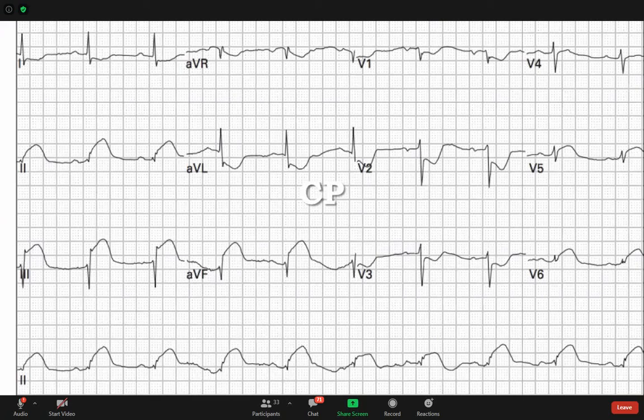So it's good. I think I agree with you mostly. بس في شيء واحد is not clear. هذا ال ST elevation can be part of the T wave. فمثلا aVF is negative وغالبا lead 2 مشكلته إنه مو واضح. So I think it's more negative than positive. So he probably has left axis deviation. But that's debatable. Yeah, you can say this is more positive than negative. So I don't think there's a right or wrong.